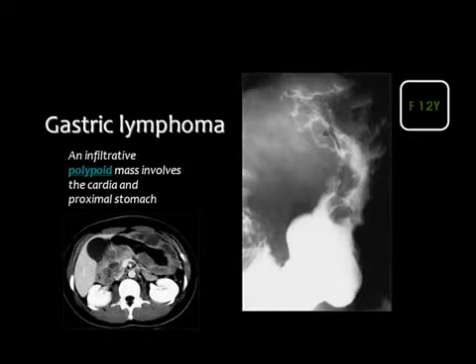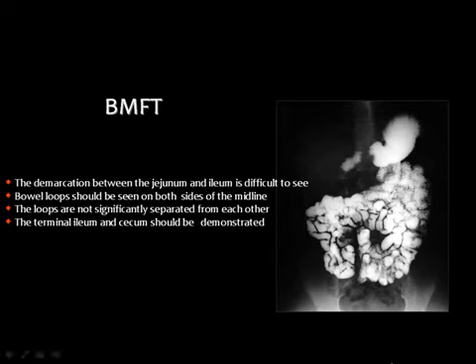All right. Then this is one of the values of the CT examination of the pediatric gastrointestinal tract. Whenever you see filling defects in the stomach, by CT you can see marked mural thickening and masses affecting the wall of the stomach in a case of gastric lymphoma.